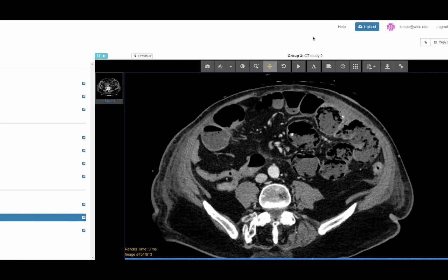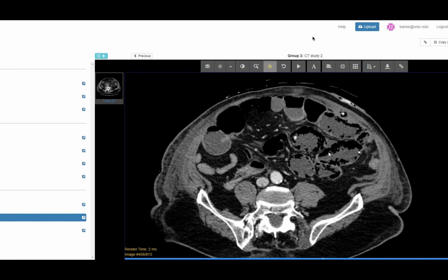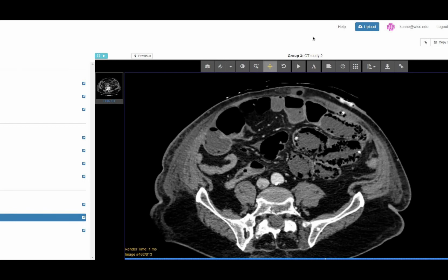You know, we've seen this in some of the lung transplants spontaneously, if it has to do with the enteral feeding or something like that. But I mean, you have to, of course, exclude something. And I just saw another case of this, and I can't figure out if it's the same one because I had to go check my records, but this looks like a different case. So we may have had a second one with this in the conduit. I don't know if anyone's ever seen that before, but the conduit was not ischemic at all.